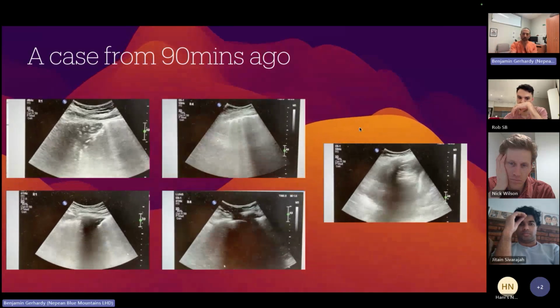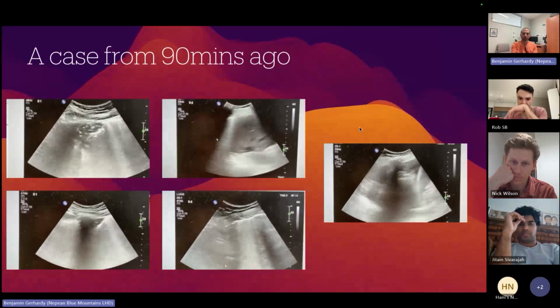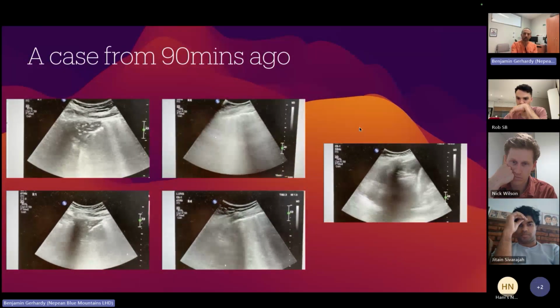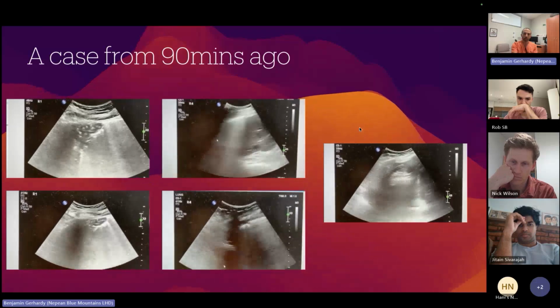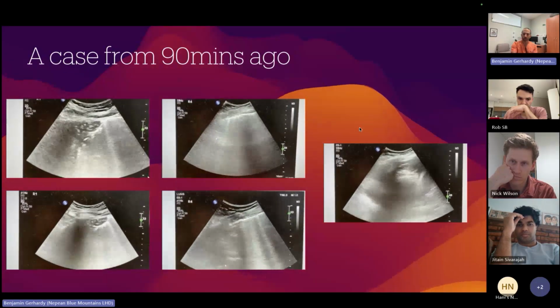It's really nice to be able to go through and go, okay, this is this, this is this, this is this. He's got an interstitial process, we've got to drain the effusion, got to dry him out a little bit, maybe, given what his lungs look like. Got to give him appropriate antibiotics. Got to be worried about developing an empyema or something on the right side, given that you've got a lot of consolidation on the right.